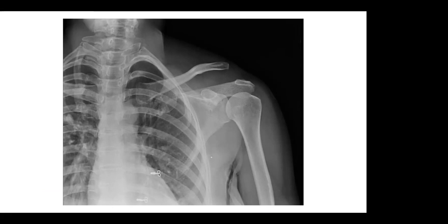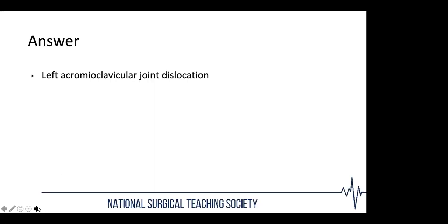People are saying clavicle dislocation, misalignment of the clavicle, AC dislocation. Yep, so very similar to one of the cases we saw earlier. Again, remember, we're looking for the 8mm rule there. So that's definitely wider than 8mm. And again, just tracing that inferior cortex of your acromion all the way across, it should really be in line with the clavicle. And here there's definitely a step. So we know that our acromioclavicular joint is not intact. So well done.